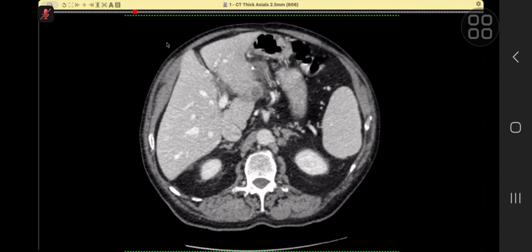We did a CT chest, abdomen, and pelvis. The chest part was normal. I don't want you to worry about that. Please concentrate on this abdomen. Over to you. Okay, I asked for the remote control. Yes, please.